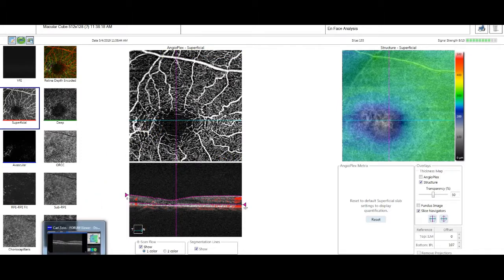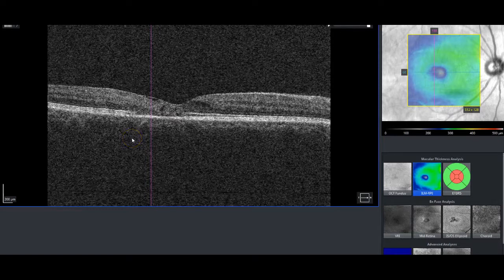Pulling back to that OCT one last time, it's all quite interesting, and if you look at enough of these cases, you'll find that they pretty much all have very similar features and become easy to identify.